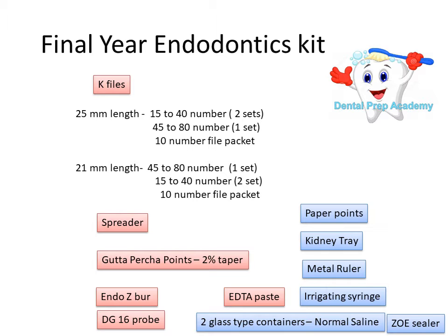So, in today's video, I am going to brief you about the endodontic files and other armamentarium you would be needing for your endodontic kit. So, let's get started.